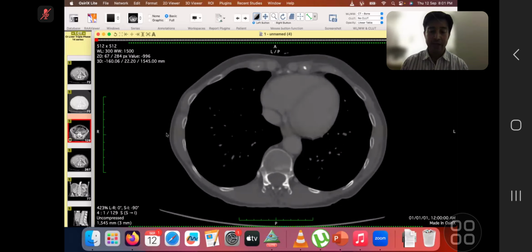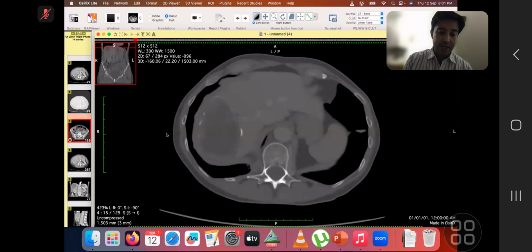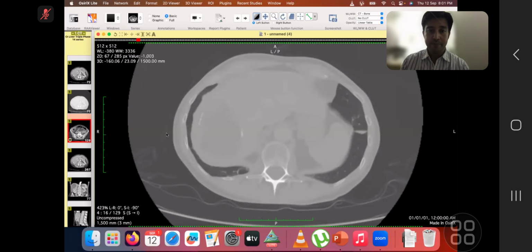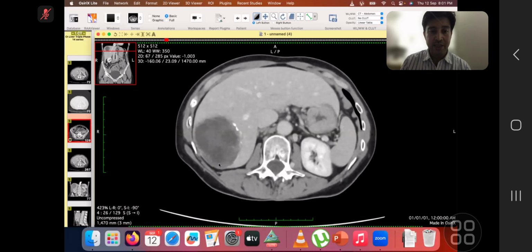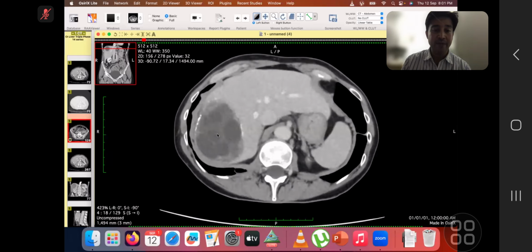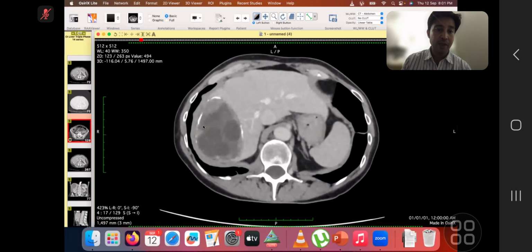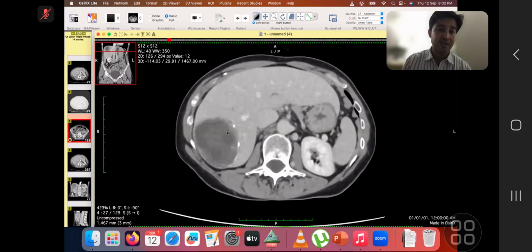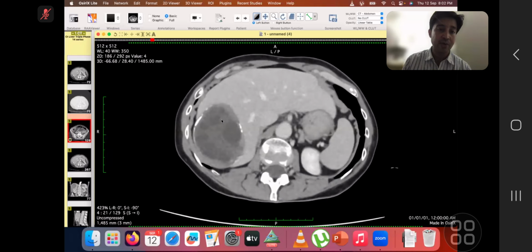Yeah, so I showed you the MRI first. It can look very confusing on the MRI, but these are very typical appearances. You see a lesion in the liver. It's hypoattenuating. It's not enhancing. You see a peripheral rim of calcification. You're seeing multiple septa, like a daughter cyst kind of appearance within the lesion, multiple rounded appearances within the lesion.